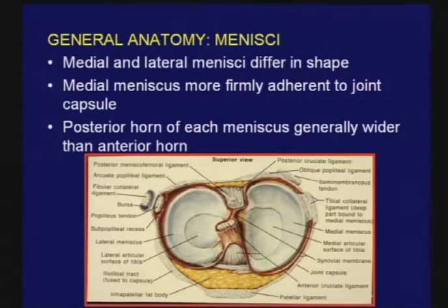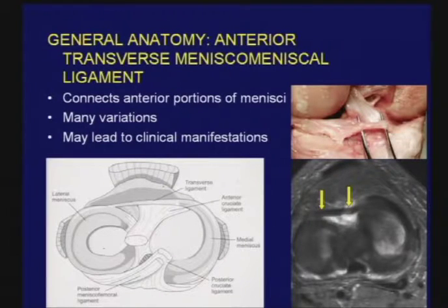This is the anterior transverse meniscal ligament. There are posterior meniscal ligaments, and there are oblique meniscal ligaments, but the frequency of the anterior one is most common. Here's a drawing, of course, of that anterior transverse meniscal ligament. I would point out to you that it extends from the very tip of the anterior horn of the medial meniscus to the convex anterior surface of the lateral meniscus.